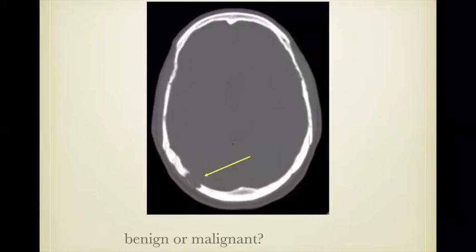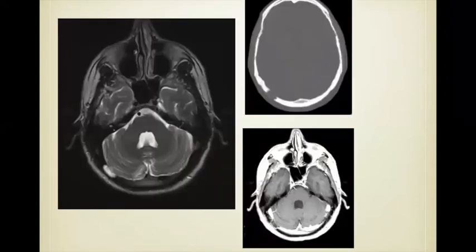Different case, now we see this lesion has kind of an unusual configuration in the sense that we have this line of bone on either side. It's non-expansile. So can we establish the diagnosis from the CT scan? Personally, I don't think I could make the diagnosis from this, but at that point, if we recommend an MR scan, we see some important findings. It has a long T2 relaxation time. It has no enhancement. It's near a transverse sinus.